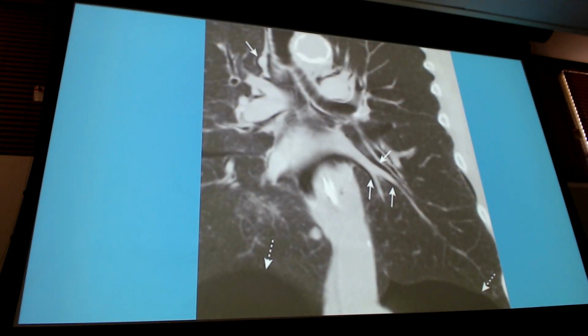What is that? The interstitial emphysema. Right? The pulmonary interstitial emphysema. And if there's only one picture I've used to show it to you, you can guess there's not a whole lot of them out there for me to pick from.